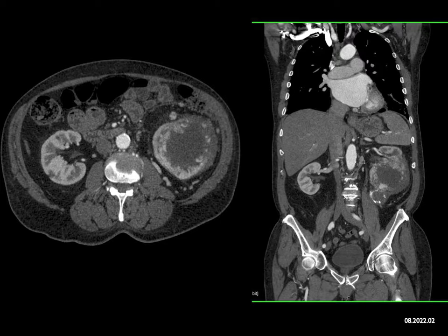One of the things that we're learning from radiomics is that when clear cells have central necrosis, those tumors are often more aggressive and often respond poorly to patients' chemotherapy. So one of the things I could tell a clinician here, not only is this likely a clear cell, but it's probably aggressive clear cell.